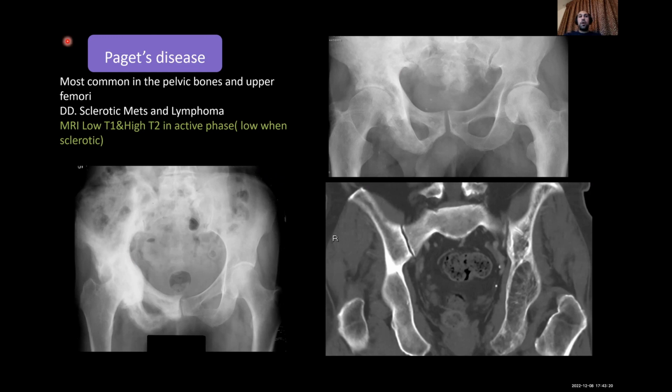Okay, so it is expansion. When I compare expansion or not expansion, sclerosis or not, it is sclerosis. Can you say that this cortex and this medulla are like this cortex? Sclerosis, benign or malignant, is apparently benign. So at that age, at that site, and with this involvement, you see this very thickened compared to this. So what is this? Paget disease. MRI, no MRI, unless there is malignant transformation. Okay.